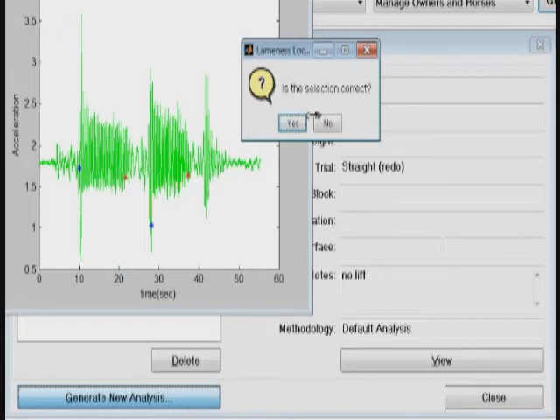Occasionally, higher values of delta are needed, in which case the user would select No again before entering another delta. It is not recommended to enter delta values above 0.5, and if needed to select strides, it is probably better to just recollect the data. The user will be presented with the window, is the selection correct, over and over again until satisfied with the software's selection of trotting strides.